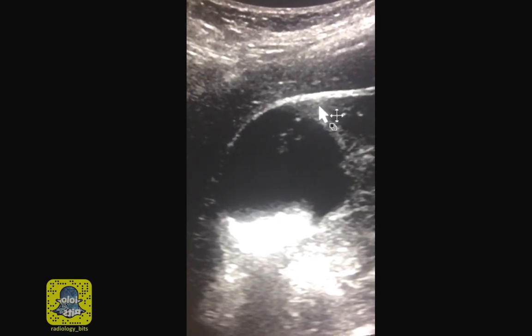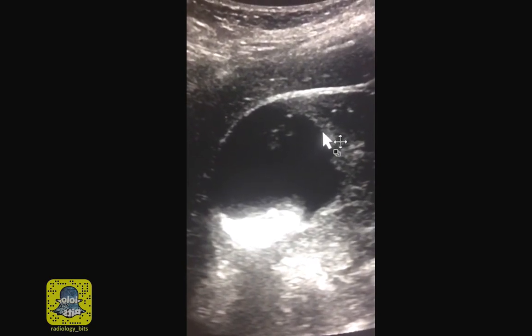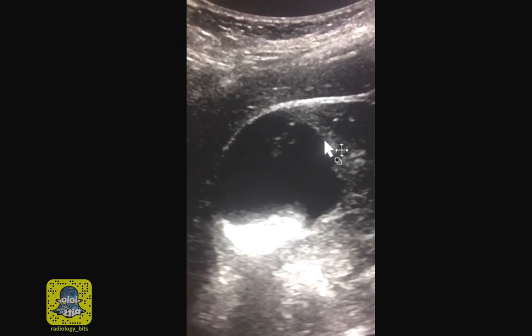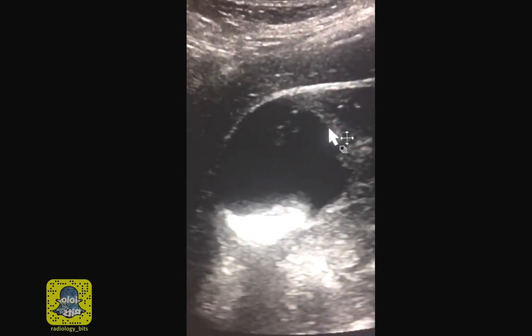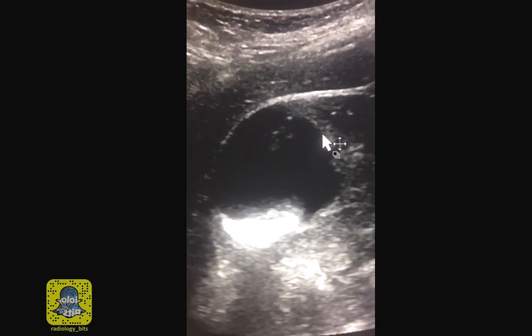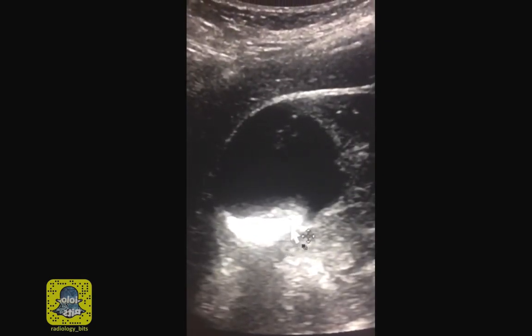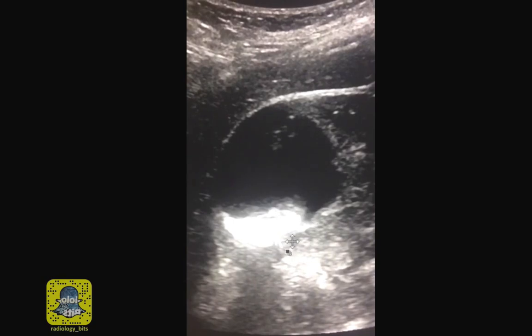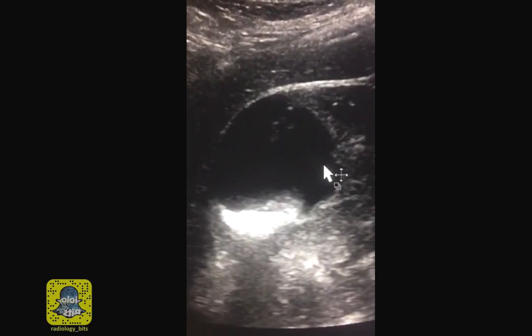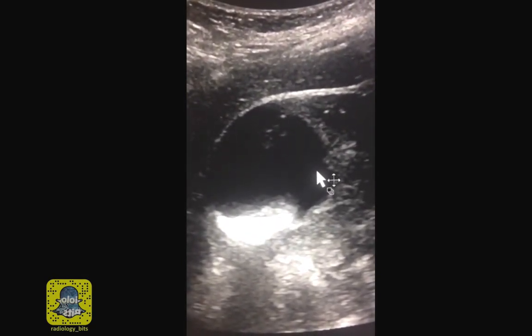The patient was scanned there while he was supine. All of the hassle and anxiety associated with this cyst would have been avoided if the person scanning the patient would have done one thing. And that's to move the patient, scan him or her on their side or in a prone position. By doing that, the radiologist would have noticed the mobility of the calcium within the cyst, and this would have been diagnosed as milk of calcium, which in turn would make this a cyst that's ignorable from the start.